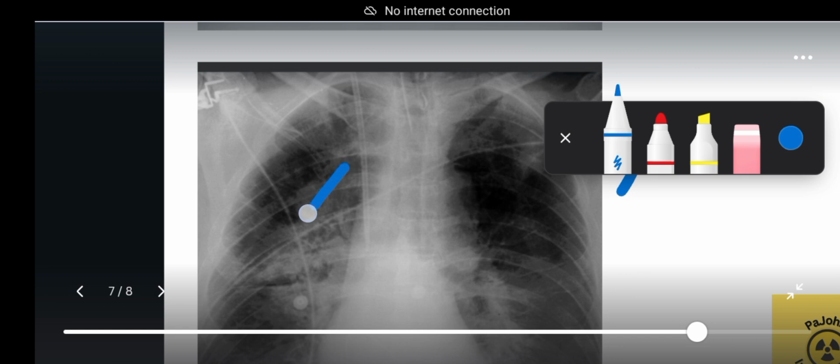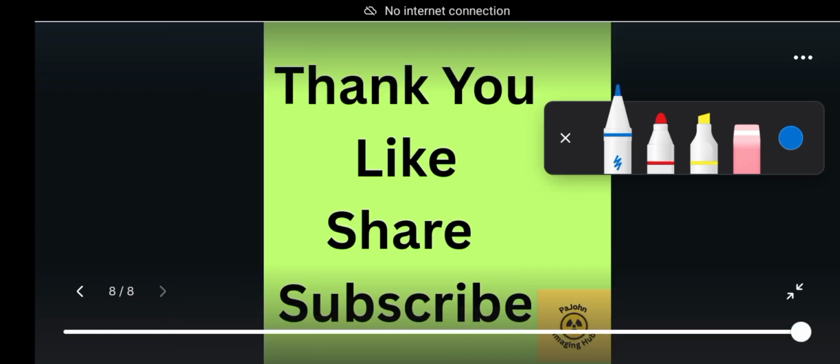In this image, you see also the thickening, enlargement of the hilum. Then you see that inside this, you see small, tiny, light lines passing linearly inside, and also tiny round opacities also. These are the signs of pulmonary edema. These are the things they look out for when you do a chest X-ray to say that you have pulmonary edema.